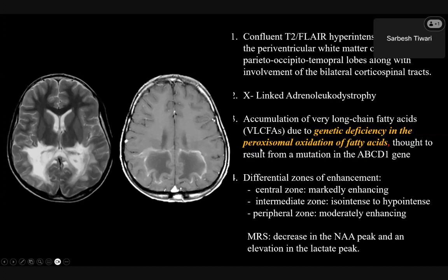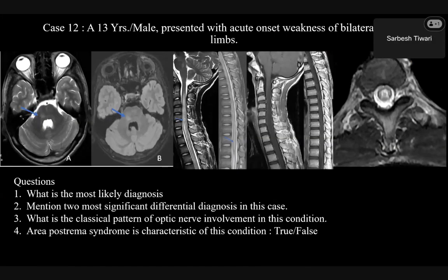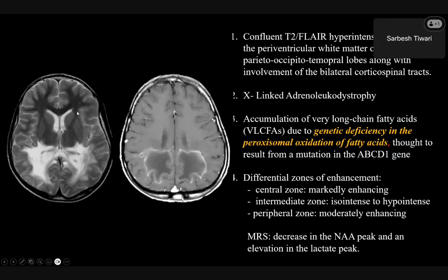So this is called a sagittal line hyperintensity. Sagittal line hyperintensity, you have to remember this from now. So whenever you see a long segment myelitis extending along the entire cord, involving the conus medullaris and appearing like a pseudo spinal canal, this is because the central part of the cord is involved. It is classical for MOGAD. This is called sagittal line hyperintensity. It is looking like a prominent central canal because of the sagittal line hyperintensity. This pattern is very, very classical for MOGAD. Okay, the differential is transverse myelitis, and I would never keep multiple sclerosis as a differential diagnosis in this case.